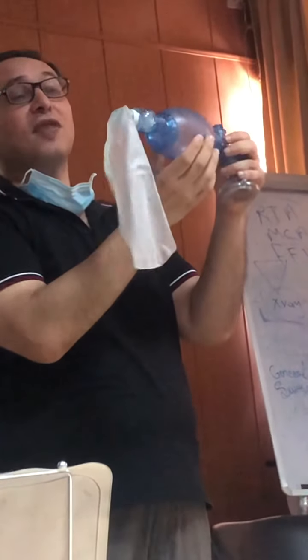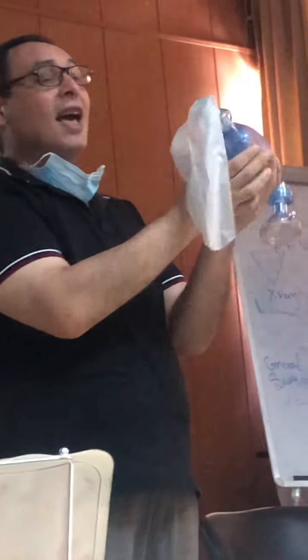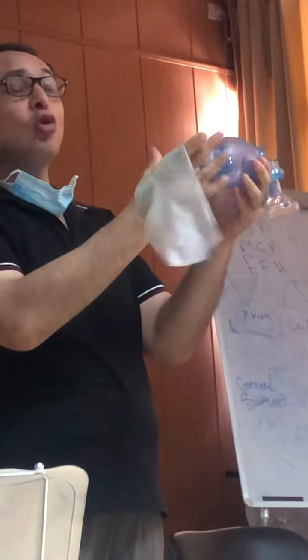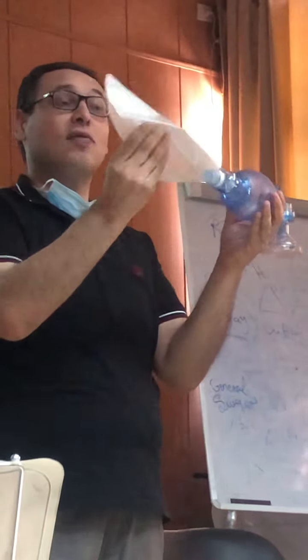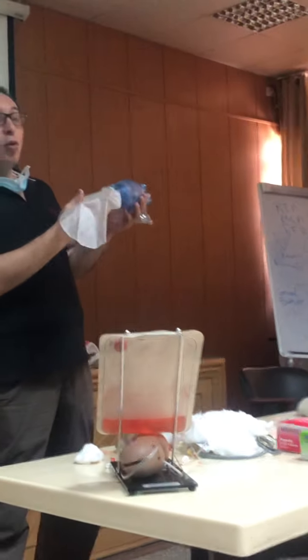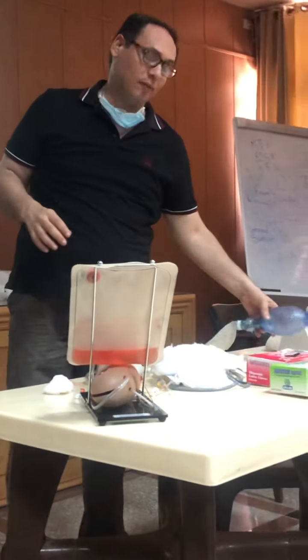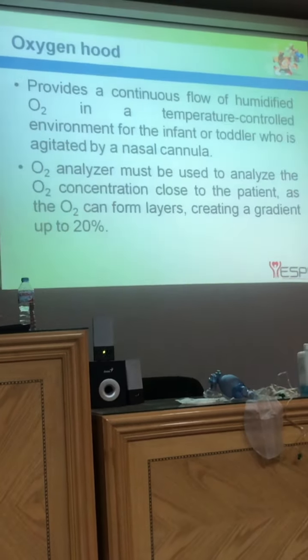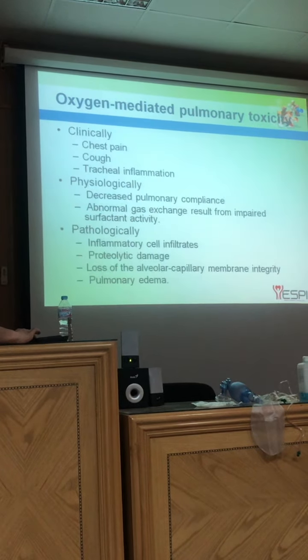The self-inflating bag comes in different sizes: neonatal, children, and adult, and a reservoir to concentrate the oxygen. The ambu bag with reservoir gives 100% oxygen. The ambu bag without reservoir gives 50% oxygen. So I should know the equipment and how much oxygen it gives in the exam.